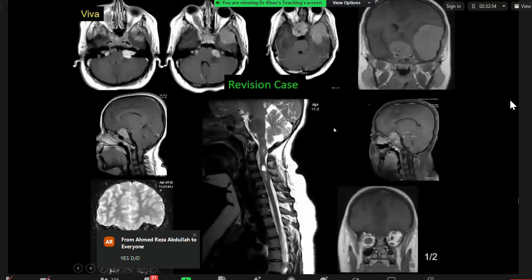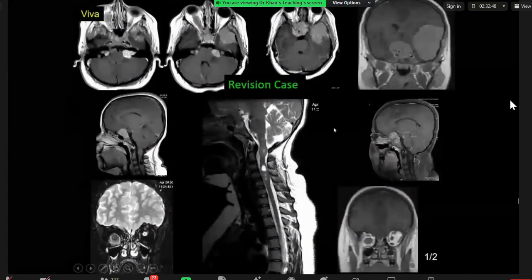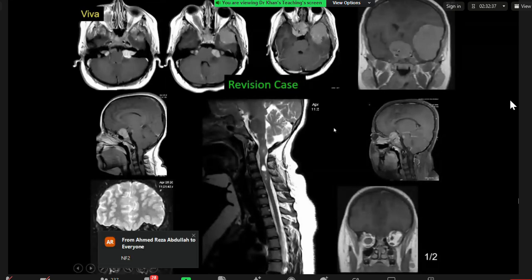In the top images, I can see enhancing lesions at the CPA angles bilaterally, which appear to be expanded. On the third image in the top row, I can see a lesion in the left temporal lobe, and I can see a suprasellar lesion. Having a look at the images of the orbits on the bottom right image, I can see asymmetry between the globes and the optic nerves. Comparing the left and right optic nerve, the right optic nerve appears to be enlarged and expanded.